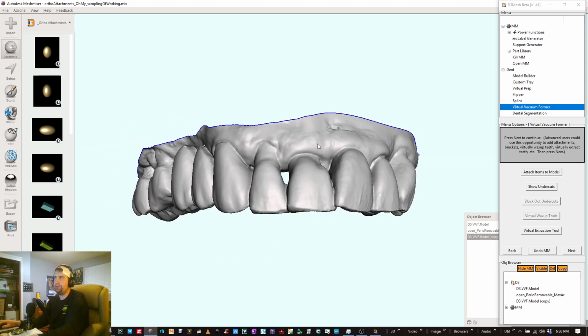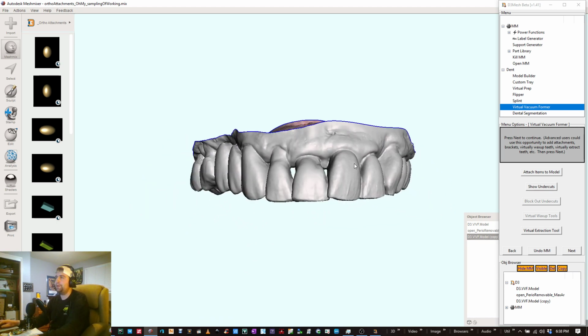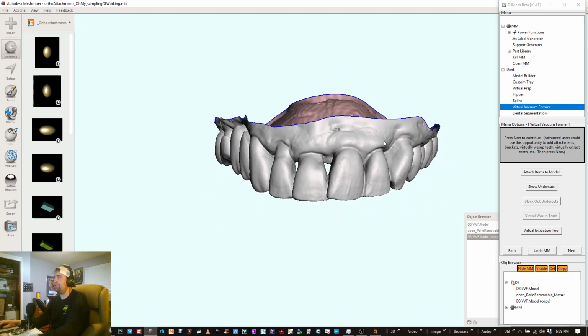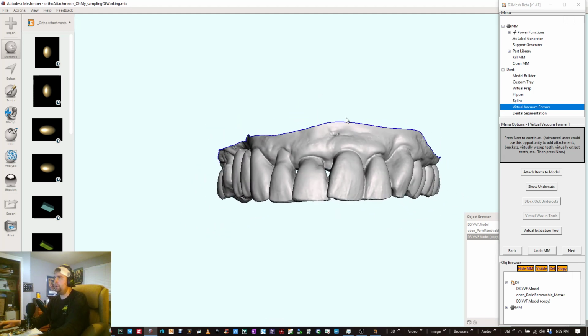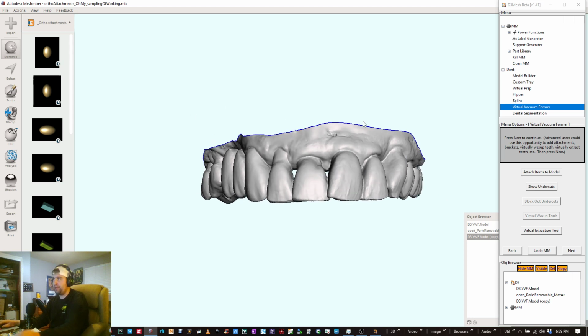And this is extremely beta, or maybe even alpha. It's just experimental. Again, very big wording here. I would say this is definitely not for clinical use at this point, unless you are very knowledgeable in 3D CAD and orthodontics, and if you have that cross section, God bless you, and you can make some really cool stuff happen. But for now, it's more of just a proof of concept.